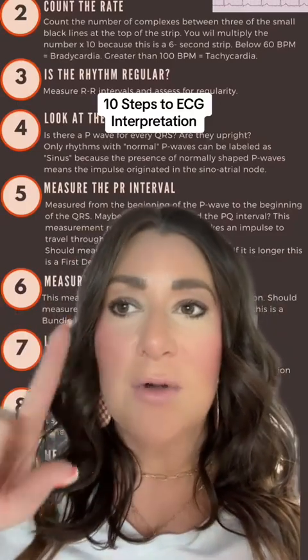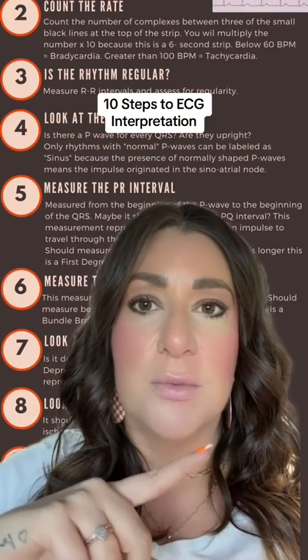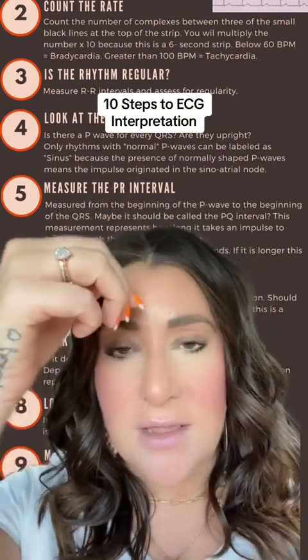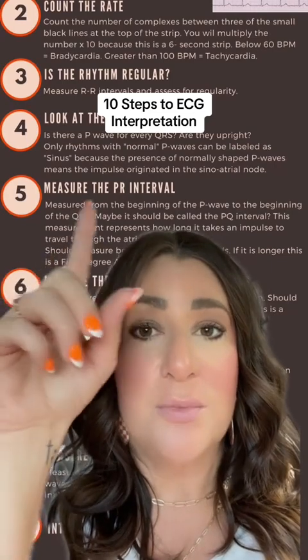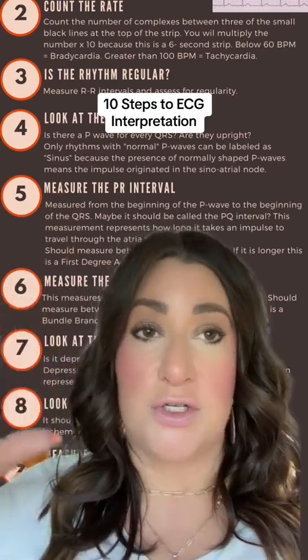Okay, so by request, I've been asked to do an ECG interpretation video. This is an old infographic of mine that I created a couple years ago that breaks it down into 10 steps. The first step, which is cut off at the top, is to know your measurements.